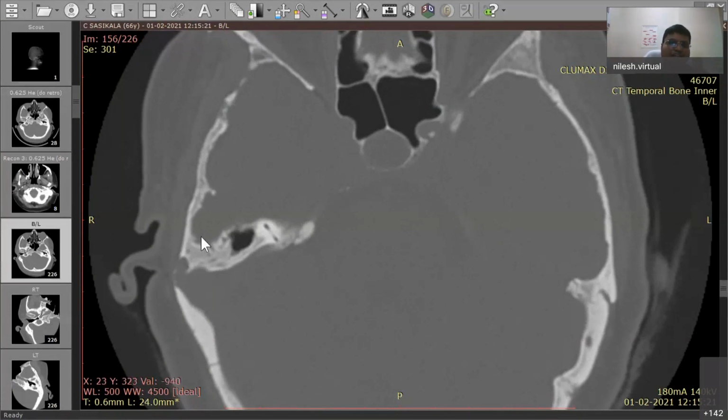These are the dangerous cases where you put your periosteal incisions over the mastoid periosteum to expose the mastoid cortex. As soon as you put a deep incision here, what will happen? Your blade will cut this wall of the transverse sinus and sigmoid sinus junction, and you will get profuse bleeding. So perioperatively, you have to plan when you are putting an incision in this particular area. You have to be very meticulous. You cannot put an incision bone deep.